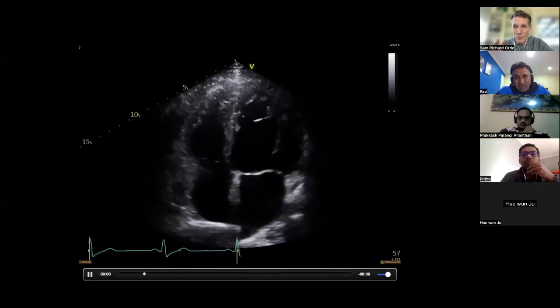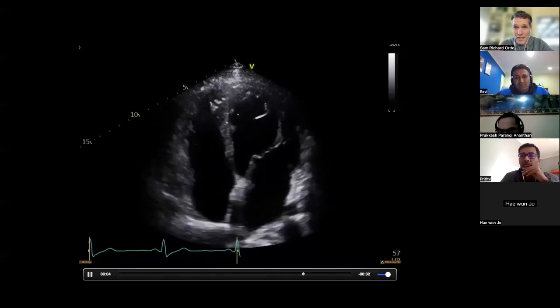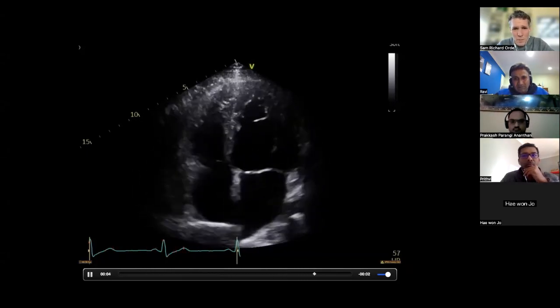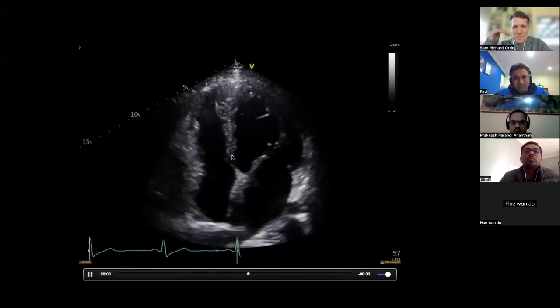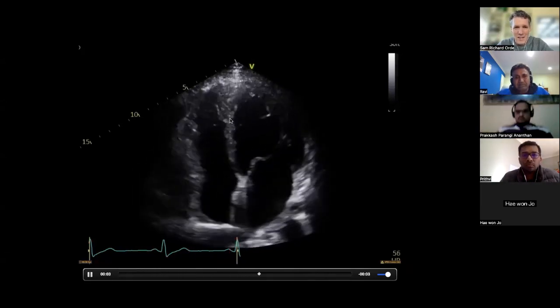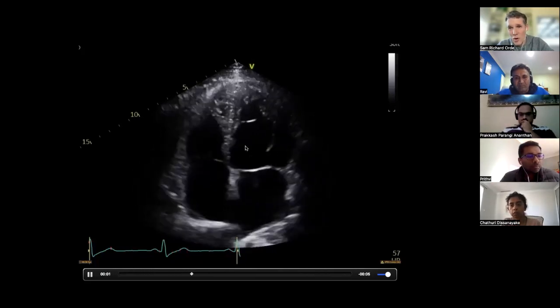And that's what's really important for the exam, is trying to make sure that we're tight with our language. Would you say it is a dyskinetic, Sam, or? Yeah, good call. I probably wouldn't jump up and down. I certainly wouldn't argue with that. It's just a big jump to go from hypokinetic to dyskinetic. Obviously, maybe we'd say akinetic in there. I think there's probably some tethering going on, but again, not pass or fail.